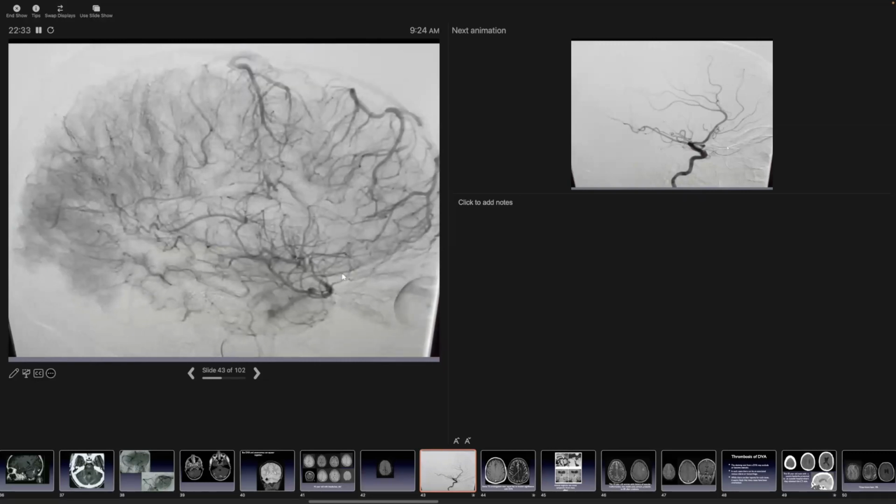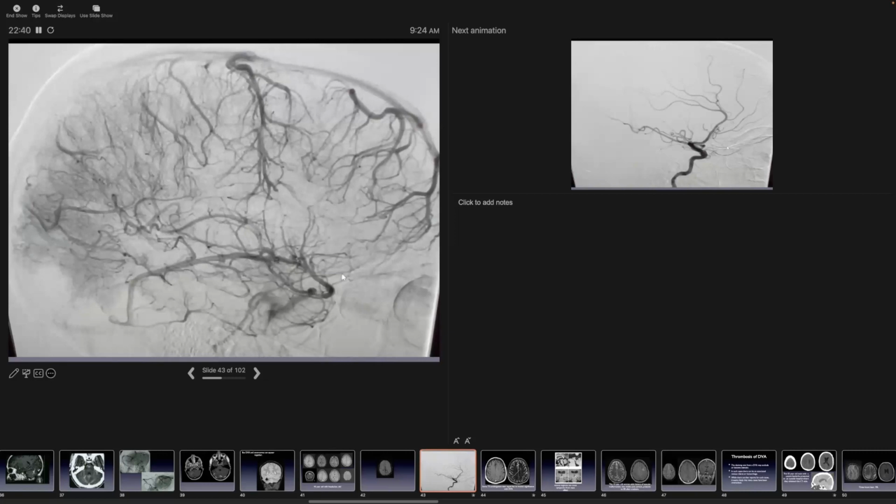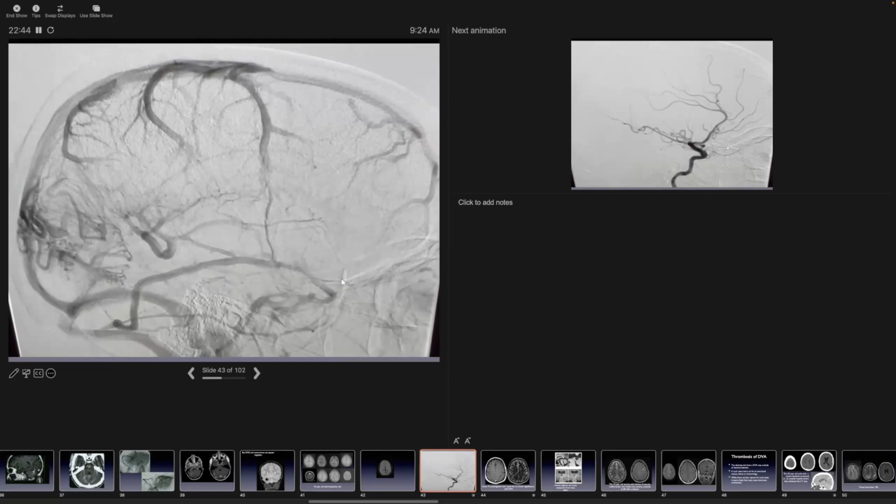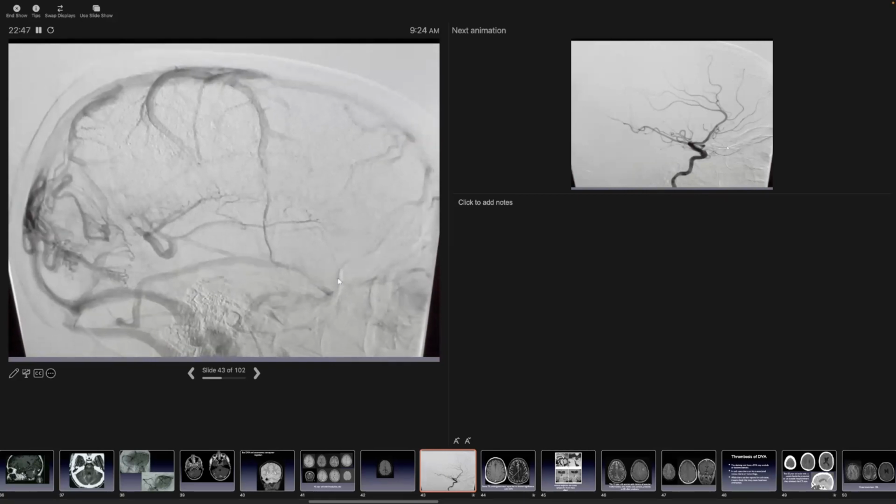Now we're starting to see the cortical veins over the frontal lobes, which are oftentimes the first cortical veins that we see. They start to progress posteriorly. Now you see these large, unusual vascular structures. So this sequence of imaging establishes the diagnosis in this patient that this represents a large, unusual, I'll admit that, but this is a large DVA and not an arteriovenous malformation, regardless of its size or odd appearance.